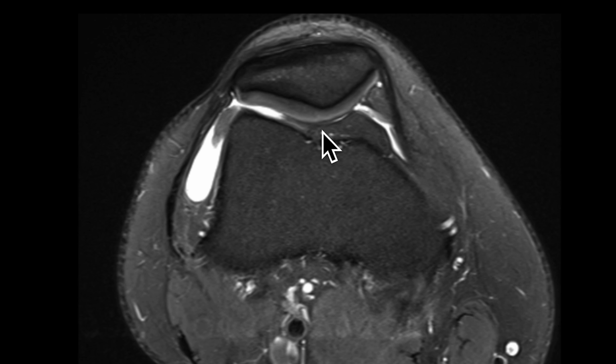In more chronic full-thickness cartilage defects, you might end up seeing a small, well-circumscribed cyst, and that usually tells you that the process has been going on for a longer time. Trainees often find grading cartilage defects challenging, and it's one of the more common areas that requires correction. We'll go through this in more detail in the case-based course. Some institutions will acquire gradient echo or a 3D sequence to assess the cartilage. More commonly, a gradient echo sequence will be acquired to assess for blooming artifact if you think there are intra-articular hemorrhagic products or calcific products, and we'll show you some examples of that.